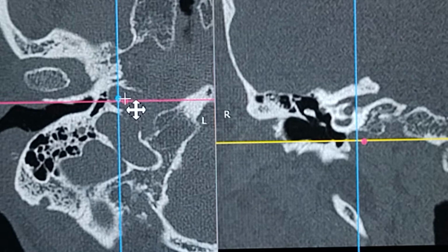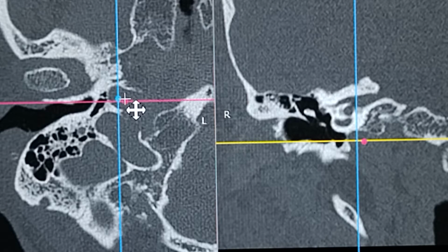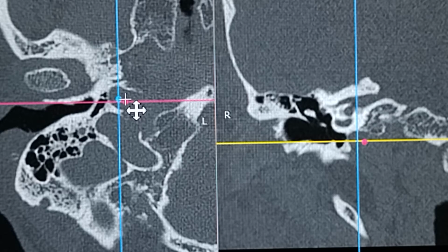As soon as the carotid artery enters from the neck, that is the parapharyngeal part of the carotid artery in the neck, it enters along with the IJV in the carotid sheath, and it enters through the carotid canal at the base of skull and forms a short vertical segment before it forms the first genu and turns horizontally, and again forms the second genu and turns vertically up to form a short vertical segment before it exits the foramen lacerum.